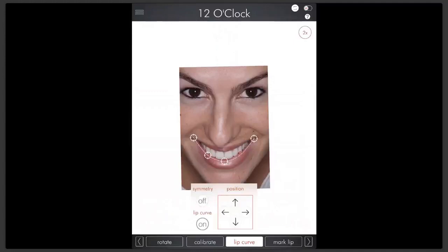So this is very important as a reference for us to see how buccal we can go. I would position this line where the wet and dry line of the lower lip is. So we know that we cannot move this new design and push it over this line, otherwise the teeth are going to be too out. I can clearly see already that her left canine is a little more out, right? So the lines help me to evaluate the case.